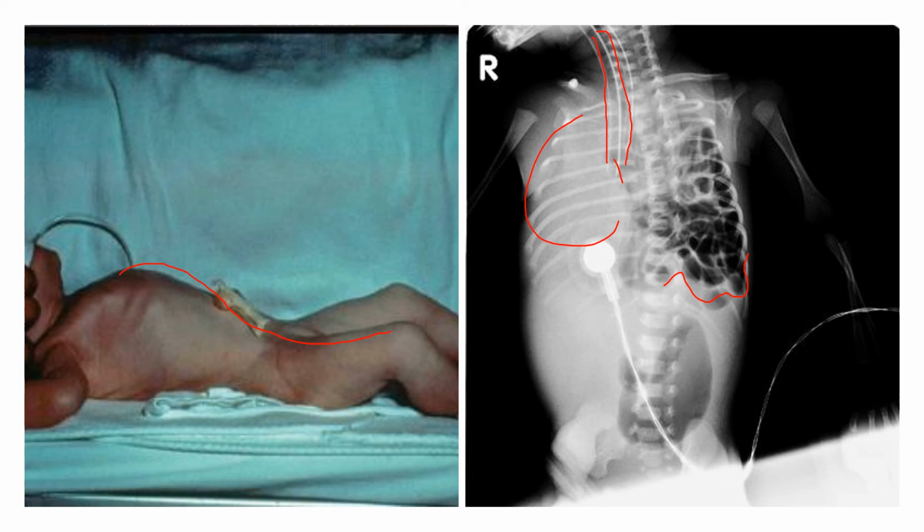Well, what happened here is this kid has a congenital diaphragmatic hernia, or CDH, and most of their bowel, when they were in utero and they were developing, their gastric contents were developing and going into the left side of the thoracic cage. So this whole thing here is actually bowel. And so you would actually hear bowel sounds in the left side of their chest. And it's more common in the left side than the right side. So it's called a congenital diaphragmatic hernia.